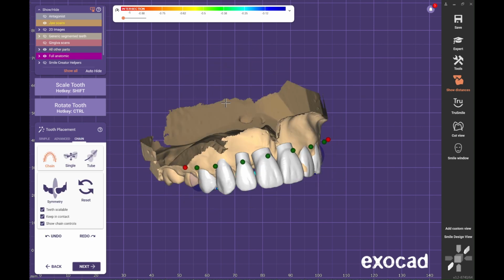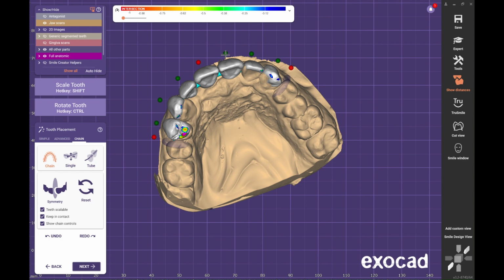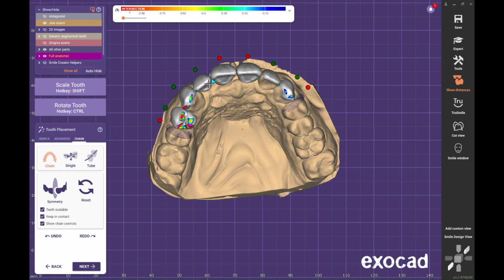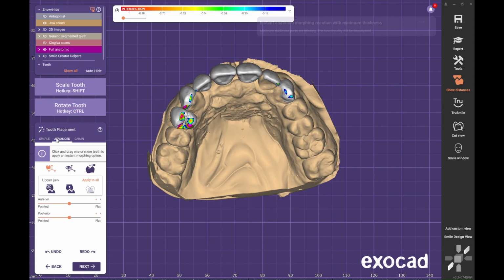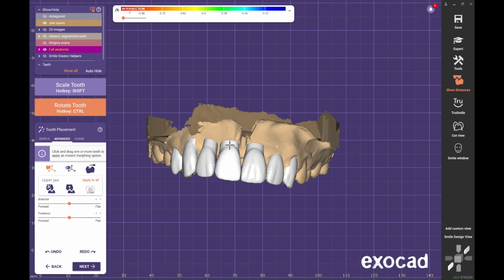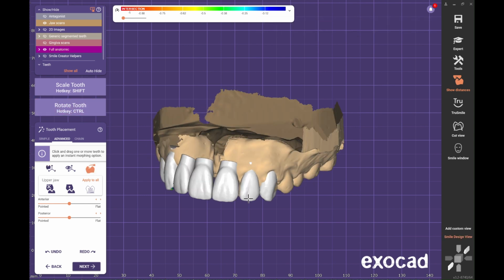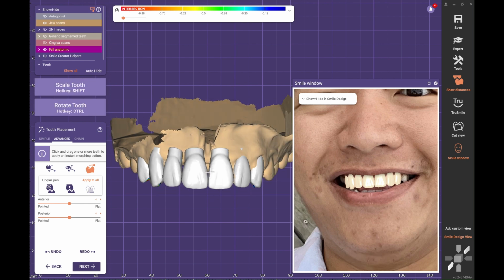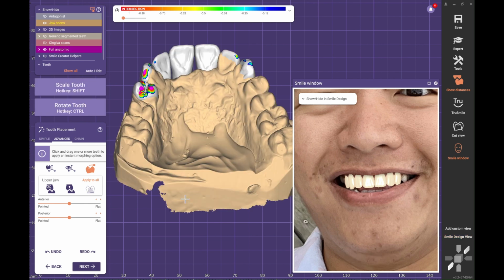All right, once you press OK, this is how it will come out. I still wanted to make a lot of changes to it. Select the chain mode, and that'll give you all at once. If you select the green dots, they turn red and it'll lock that tooth in place, and then the other ones will move proportionally if you're in chain mode.